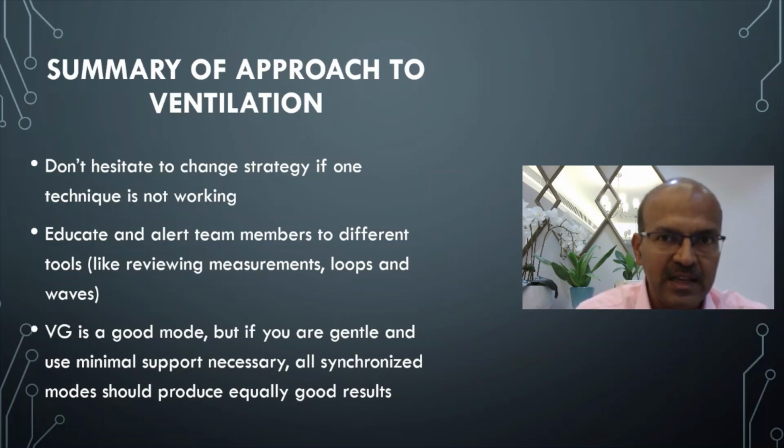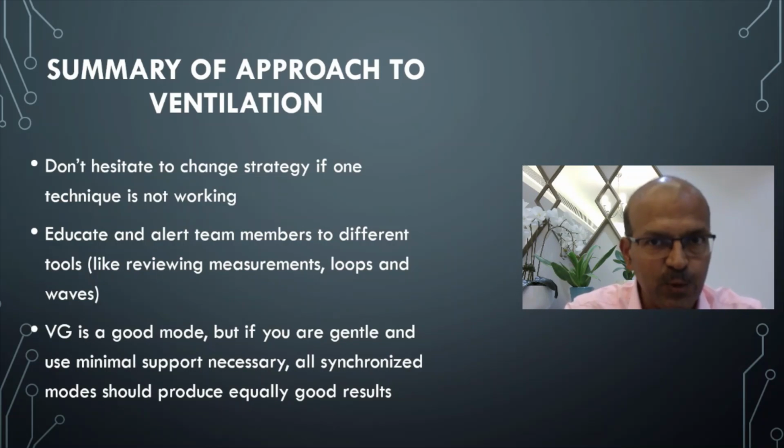It essentially becomes, suppose the baby is having a tidal volume of 6 and you're achieving that with a PIP of 10 or 11, and your PEEP is 5 or 6, your delta P is only 5. So the baby is getting essentially a delta P of 5, and that is basically like ET CPAP, which is not ideal, and we want to avoid the increased work of breathing in the tiny babies, and that's why I mentioned a short period on SIMV in this group may be okay.